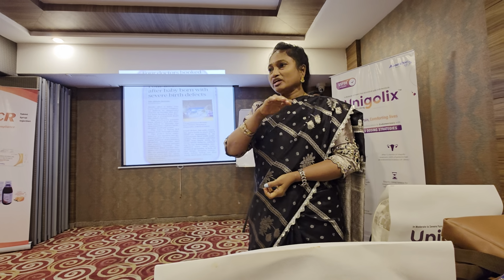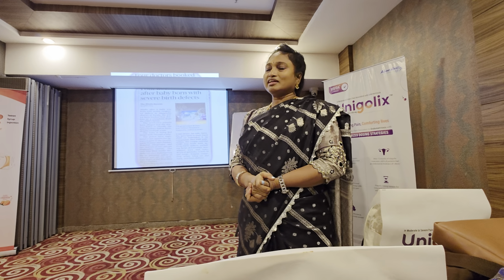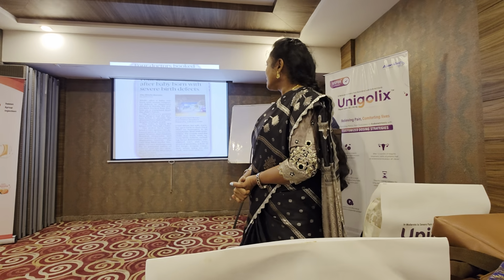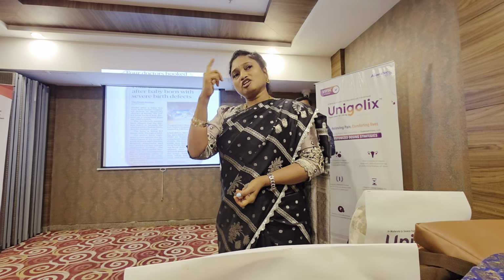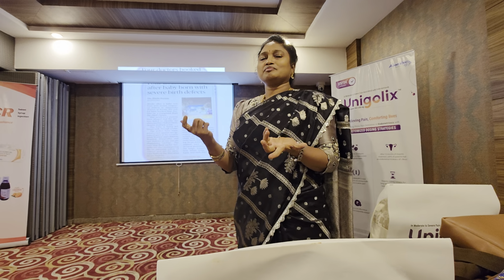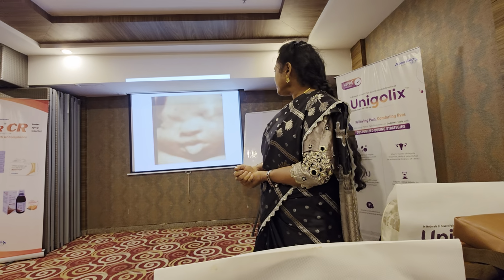If you are doing a basic scan, if you find something wrong, please refer for a higher end scan, like a TIFFA scan and all that. Don't tell them it's okay, everything is normal. Always have your TIFFA. If something is wrong with TIFFA, get a second opinion. Because missing out extremities and missing limbs, it is a crime. So be careful. Next one.